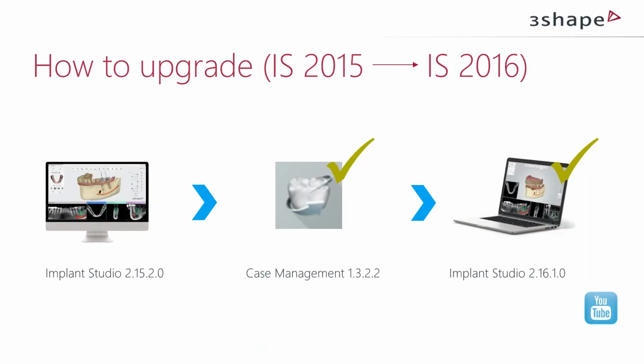You will need to go to Subscriptions and click Update to download New Case Manager 1322. When the new Case Manager is downloaded, it will start automatically, and then Implant Studio, Anatomy Design, and CAM Export Save modules will be installed automatically. Then all three modules are separate modules, but all of them are needed for Implant Studio because they are parts of Implant Studio workflow, so should be installed all together.